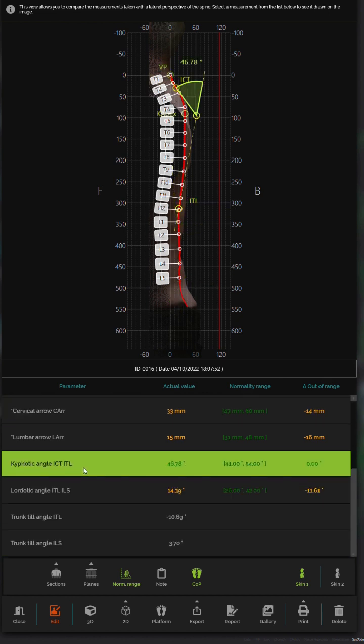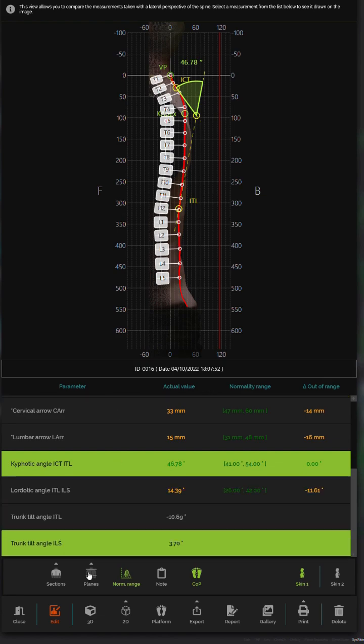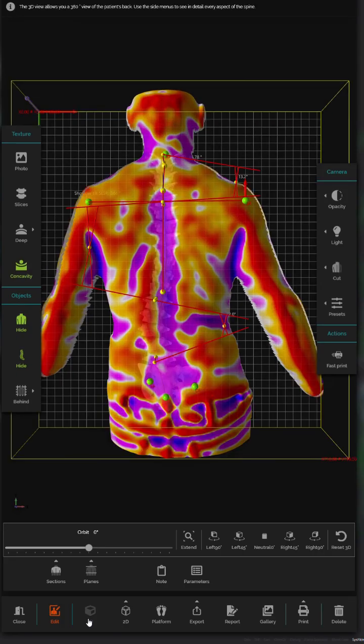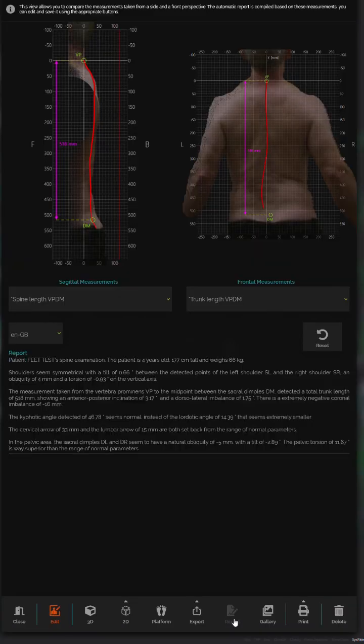And as you'll already know, there's a huge incidence between chronic adult back pain and the loss of lordosis. And so without needing an X-ray, we can predict the amount of curve they have from a scoliotic sense or a lordotic kyphotic sense, and develop a management plan that can work in 3 dimensions.